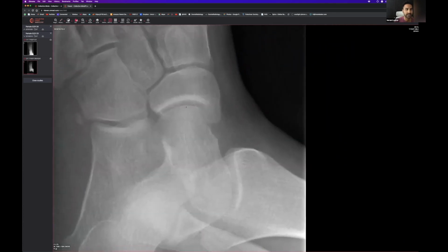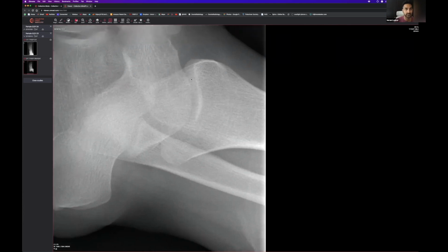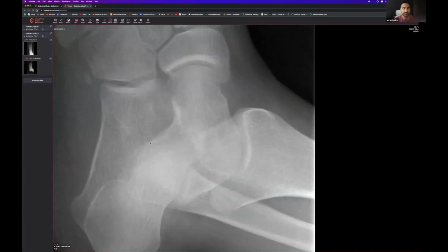Right, so another high yield area would be to look at the distal fibula. That's a very cheeky place where these fractures can sometimes get missed, because someone comes in with foot pain and they don't realize that their pain is actually coming from much further up, from their ankle. So it's quite important that you have a look at those significant areas. But at the moment, we haven't seen anything particularly abnormal.